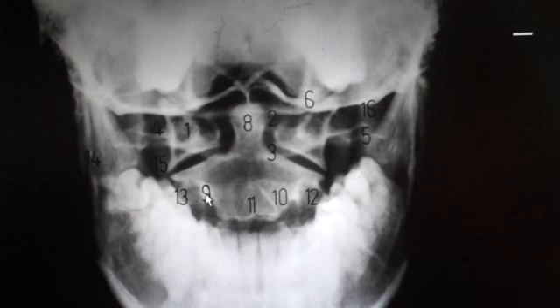Number 9, which is this white density right here. Let's go to the other side, just beyond number 10. This white density right here is the pedicle of C2. And then number 10, you see a density change right along right here, across.